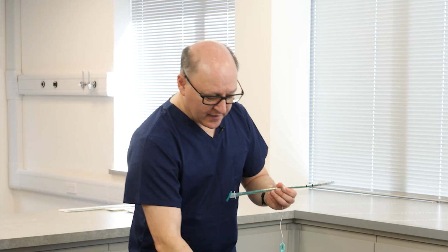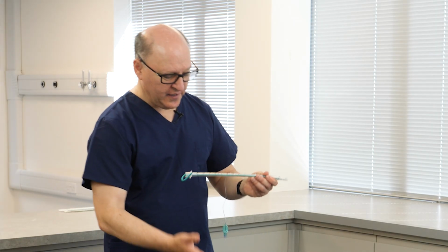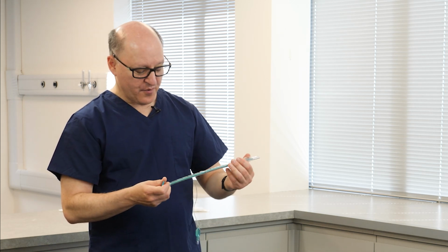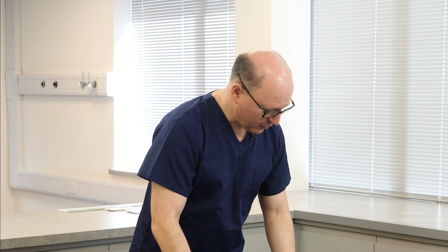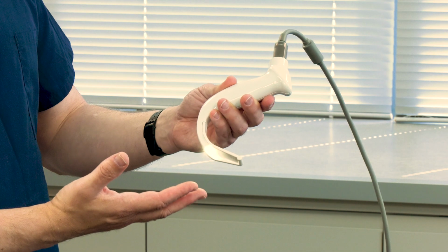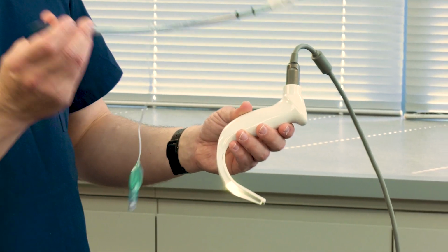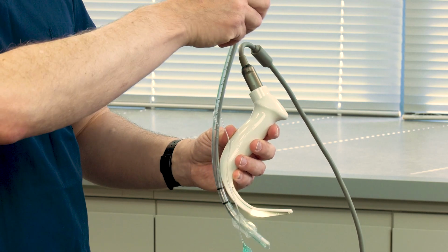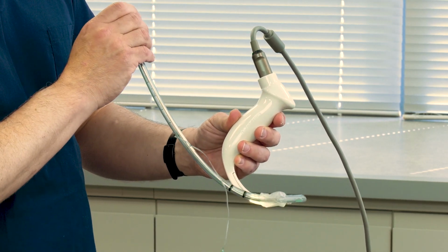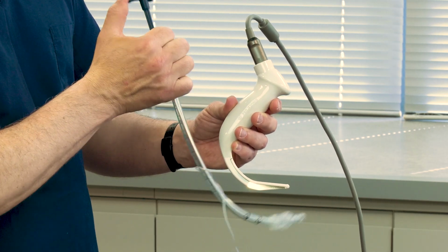But in addition to having a bougie, having a malleable stylet, when we introduced hyperangulated video laryngoscopes, the first of which was the GlideScope, Jack Pacey realized that it was useful to have a rigid stylet to introduce this, get around the curvature of the blade, and then pop this into the trachea and to introduce the tube that way.